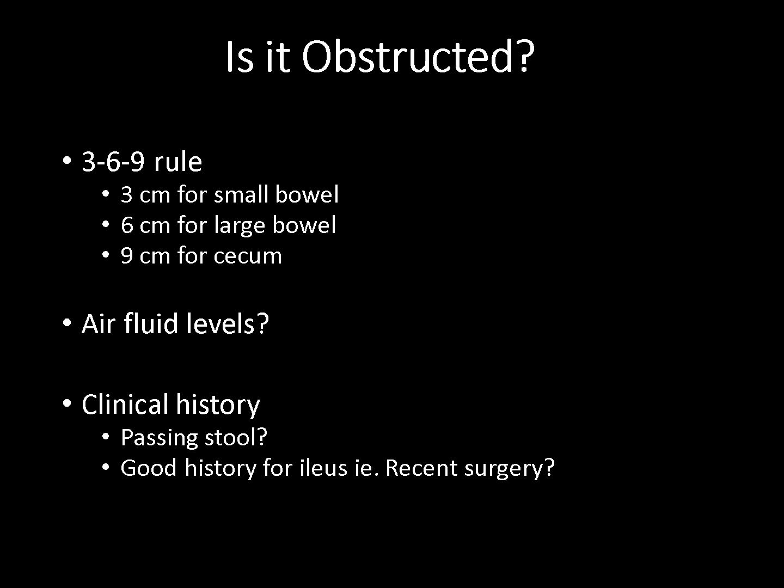dilated. In the large bowel, that is up to 6 centimeters, so it can actually be normal for large bowel to be a little bit larger in caliber than the small bowel. So we don't start calling it dilated until it measures at least 6 centimeters from wall to wall. That's an even greater measurement for the cecum, which can actually measure up to 9 centimeters normally.